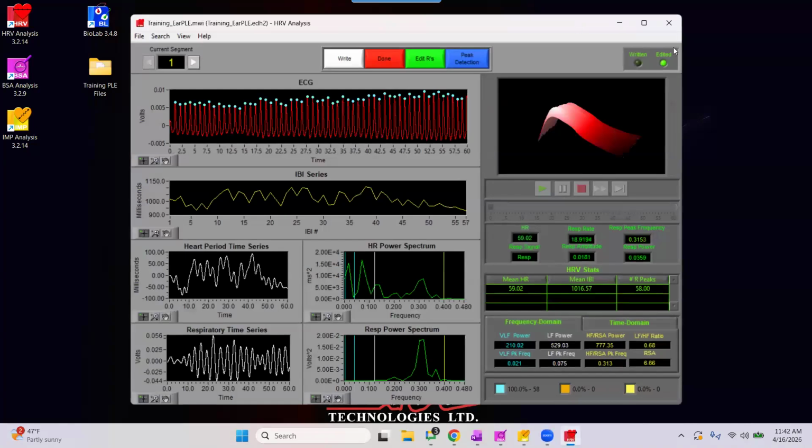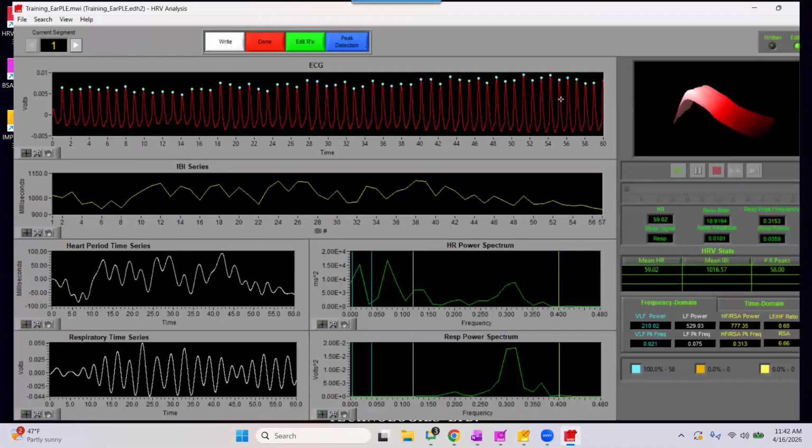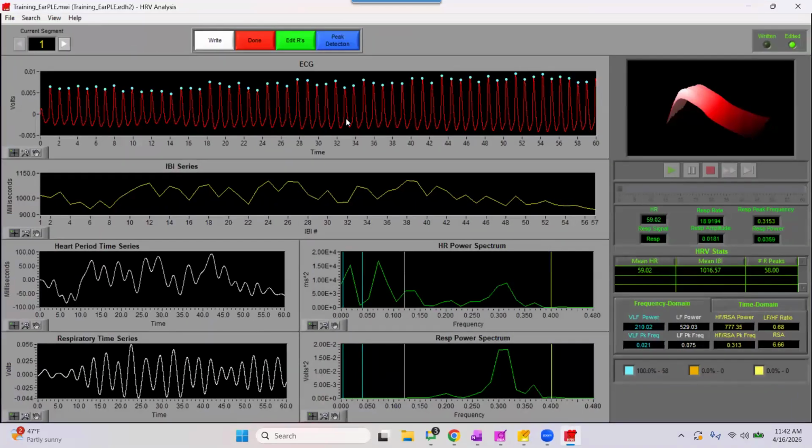When I hit analyze here and load in my PPG waveform, what you will see is that this is going to mirror much of the same processes of our HRV editing, where our algorithms will come in and do some point detections for us, indicating that blue dots are indicative of good beats and yellow dots are indicative of artifacts that need to be examined a bit further.